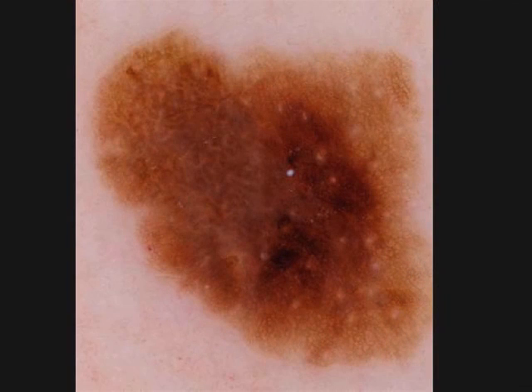In reality, most of the time when you see a negative network, you'll see it like this. But if you remember the definition, you'll still see the same thing: relative hypopigmentation adjacent to these curvilinear, elongated brown structures. Does everybody see that? Yes. And here, notice again the same process. Right up here, same thing, relative hypopigmentation around these elongated brownish structures. So that's the definition of a negative network, and if you have that, it defines the lesion as melanocytic.